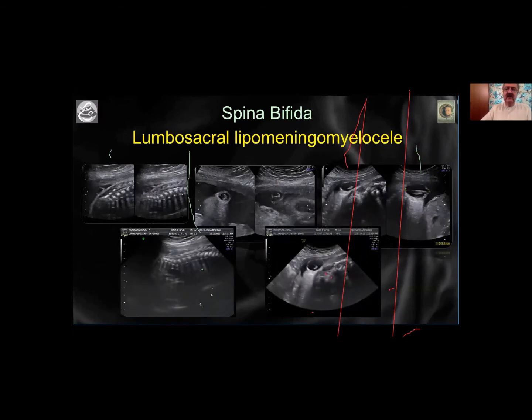The other consideration is that when we look at the actual abnormality in a neural tube defect, it's not just, okay, there is a lumbosacral spina bifida. That's not enough. What you should expect from your report, and if you're doing your own scans, what we need to mention in our report is, yes, that there is a small or a large lumbosacral defect. It doesn't seem to have skin on top. So obviously, if there's no skin, I know this is an open neural tube defect.